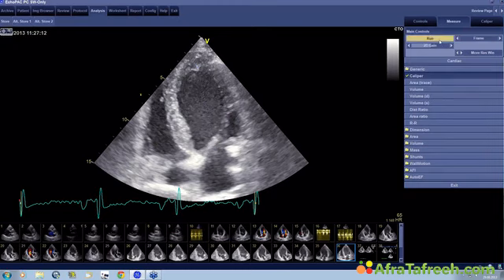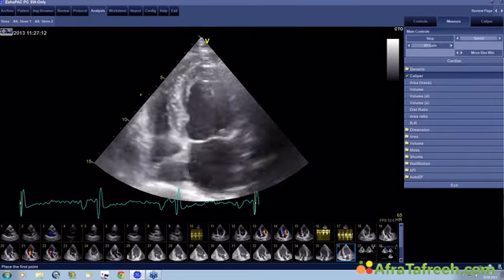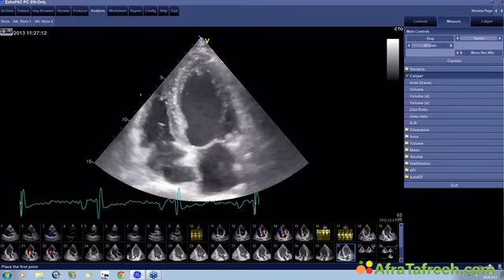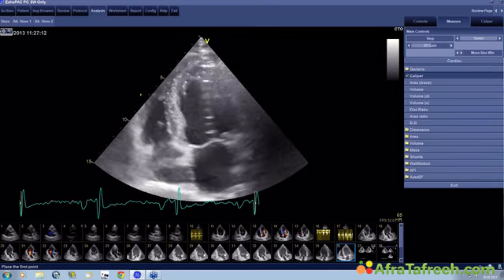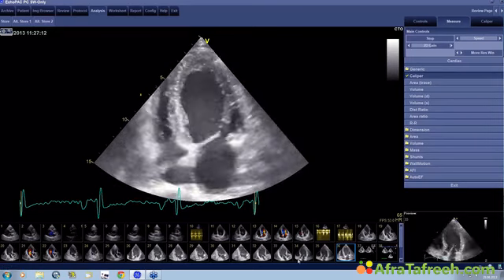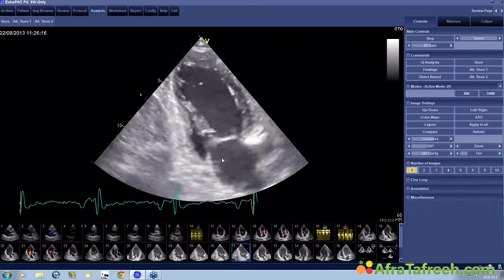And if you now look at the wall motion, what you have to do is look at several things. The first thing you look at is how the myocardium is thickening. Thickening is an important factor, but don't believe the textbooks. It's not the only thing to be looking for. Look at other things as well, such as hinge points. I will show you what I mean by a hinge point in this view here.